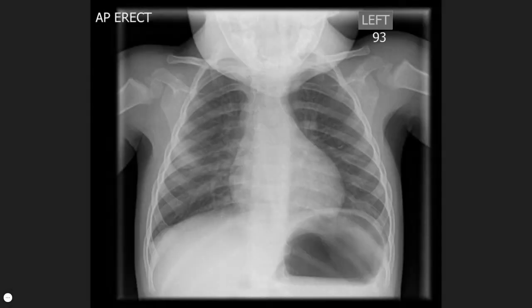This example is a chest X-ray of a 2-year-old who presents with a short history of fever and cough. The appearances are relatively unique to children, showing rounded opacity in the right midzone in keeping with round pneumonia. Although the etiology is debated, the most likely cause for this is lack of or immaturity of the collateral airways known as the pores of Kohn. In the presence of a typical history, the patient does not require further imaging follow-up.